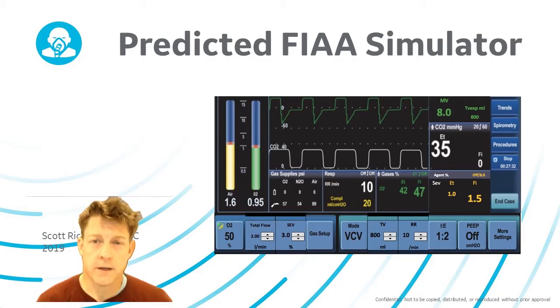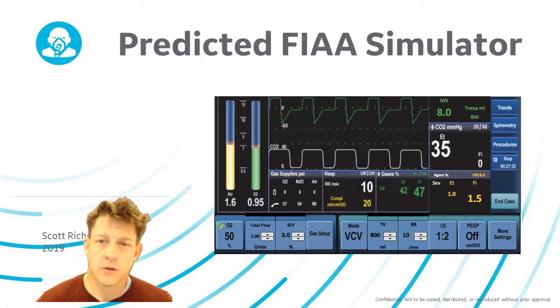I'm a clinical education specialist for anesthesia and respiratory care, and this is an introduction to the predicted FIAA simulator, or the Fractional Inspired Anesthesia Agent Simulator, and it demonstrates the dilution effect.